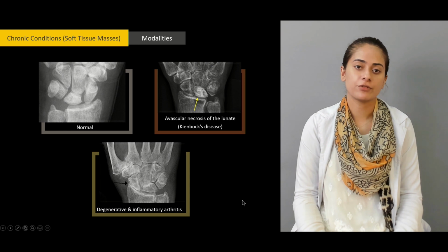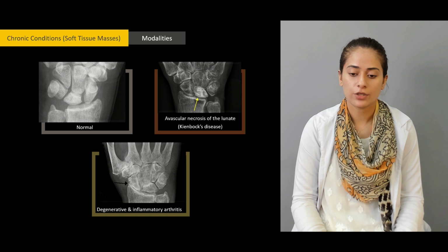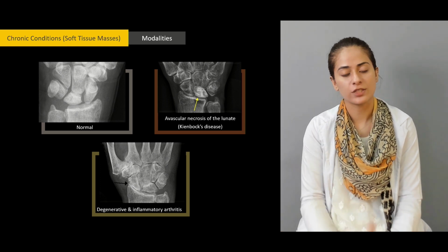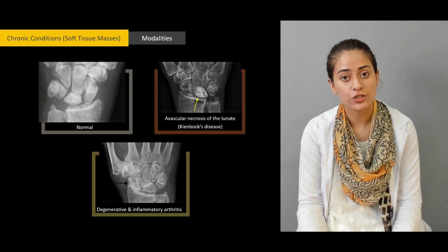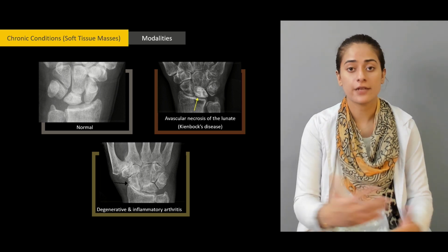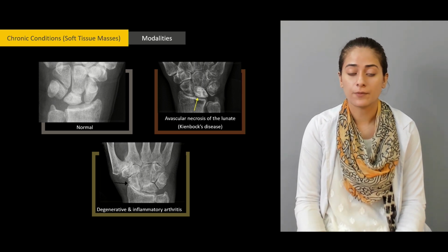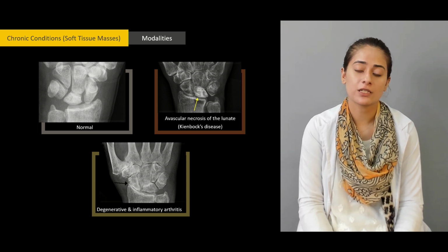And then we have degenerative joint disease. We can also call it osteoarthritis. So here it's a degenerative and inflammatory arthritis. All the same characteristics of osteoarthritis: joint space narrowing, sclerosis, osteophyte formation, cartilage degeneration. There will be increased friction, which will again result in some osteophyte formation or further decrease in joint space, and further degeneration of the cartilage.